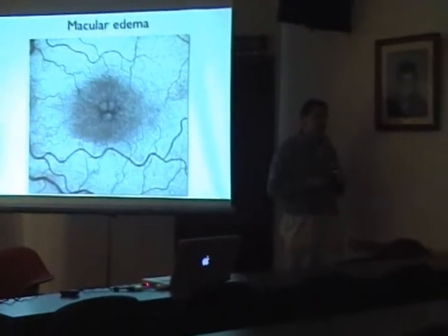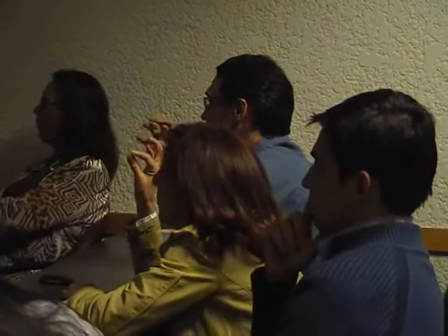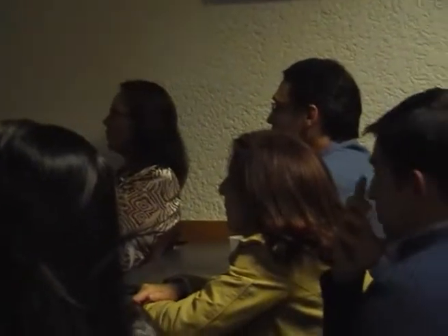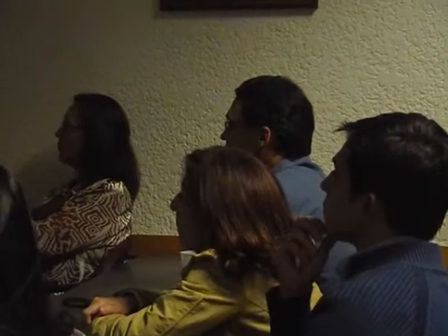The light can pass through the cyst more easily than the rest of the retina. Why? Thinner. But why is it more transparent? It's thinner. The pigment is displaced. So all the macular pigment is displaced by the cyst, and so you see through.